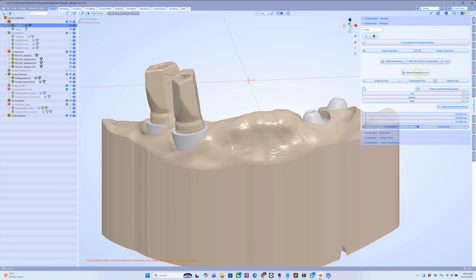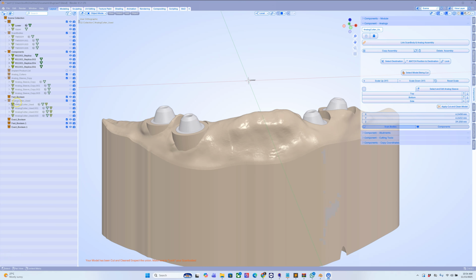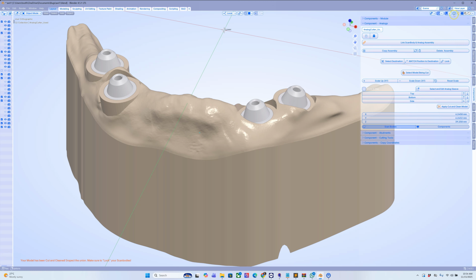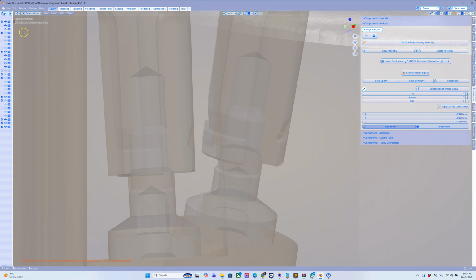So I'm going to fast forward this. Looks like we've had two fast and two exact. So there's still an issue, and I'm going to show you what the issue is. This is easily missed. Actually, I missed it on my first go.